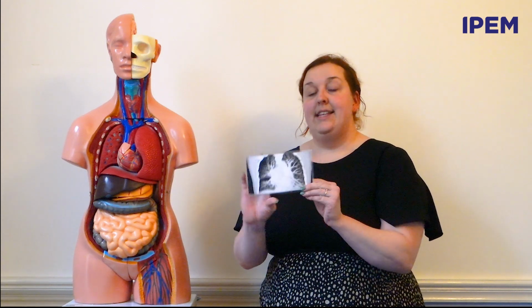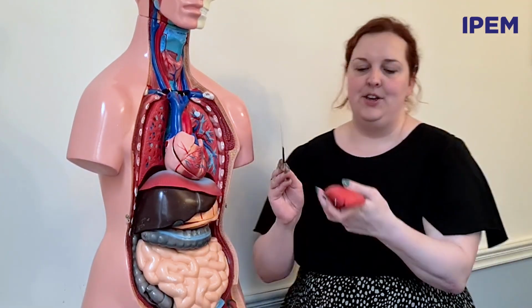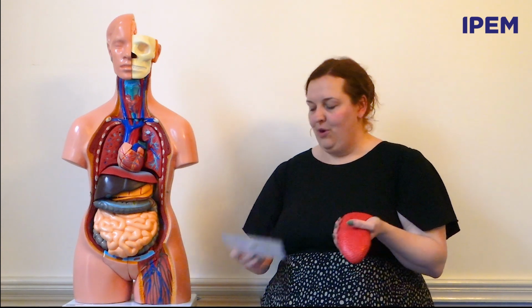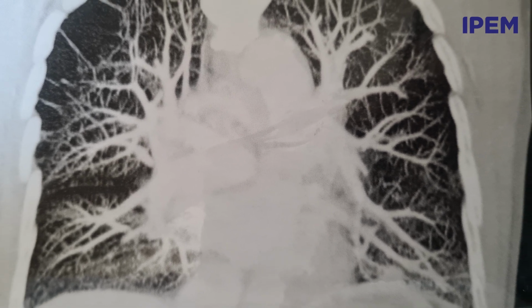So this is the first one. And this is a CT scan of the lungs, which are here. And you can see from the lungs, from the texture, that it's very light, which you would expect. Obviously, lungs are always filled with air. And the reason why I know that this is a CT scan of the lungs is because the lungs are showing up black. And that means that there isn't as much density in there for the radiation to sort of bounce off of and create an image. So that's why it shows up dark.